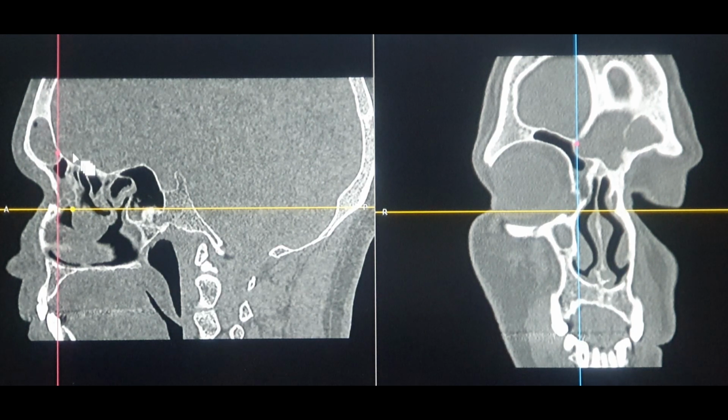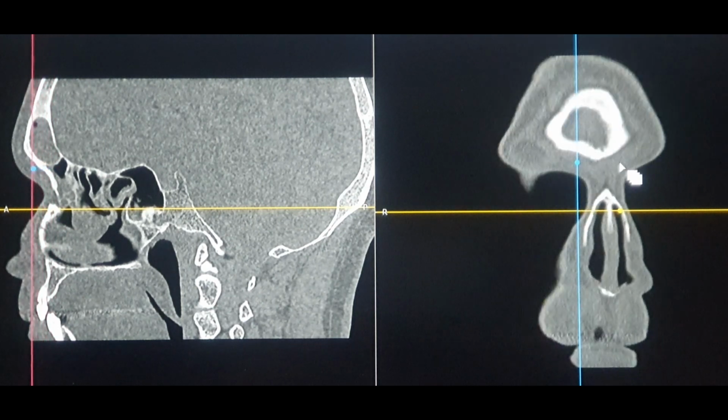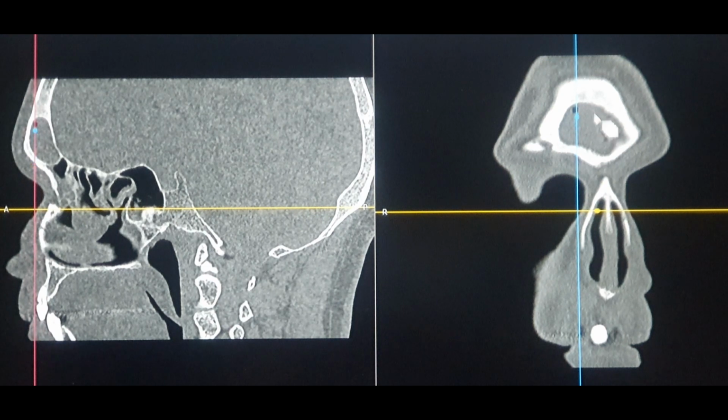Now we should know this for sure on the patient's coronal scan and then cross-check again on the patient's sagittal scan. Now if I come very much anteriorly on the patient's coronal scan, you can actually see, if I start going behind, there's a huge single opacification in the frontal sinus. So far this is a huge cell, we cannot see any other cell so far, okay, and we can cross-check over here. It is one uniform cell without any interfrontal sinus septum.